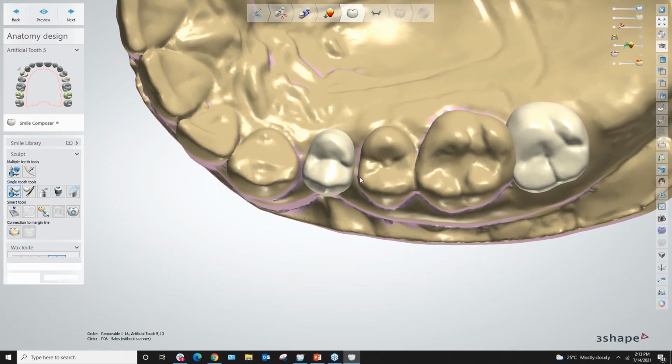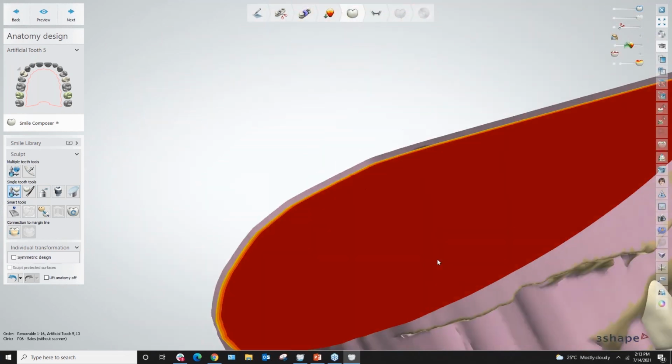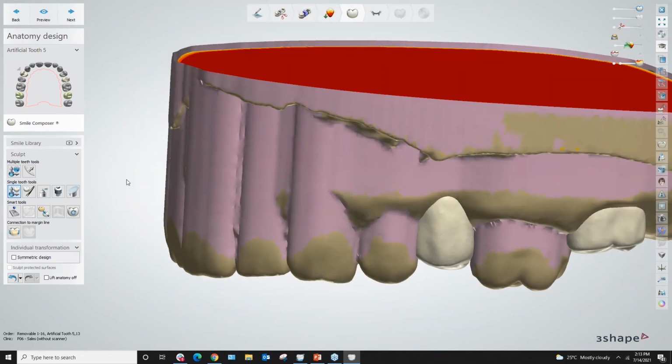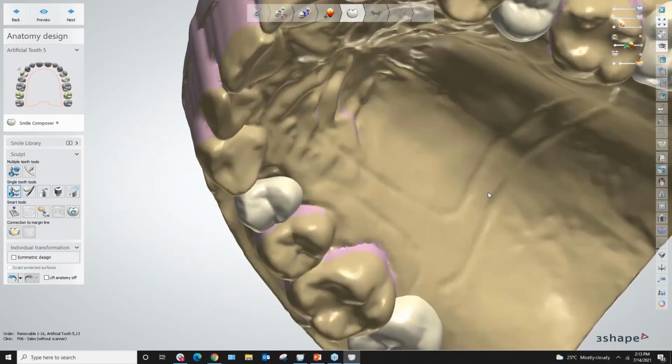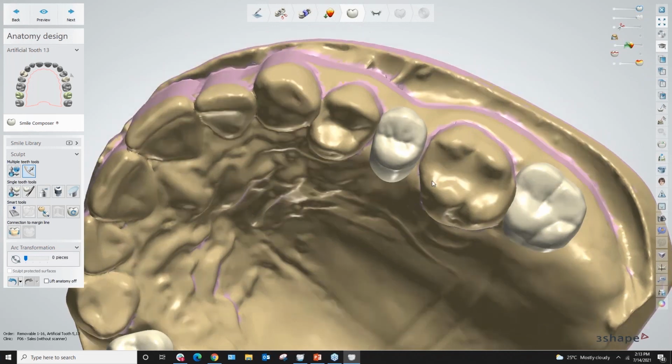Now let's jump ahead and do the same thing for the other side using the same tools with patients. So I will just position it in a way where I can actually have access to it. So first up, I will work on my size. So the size would be a bit more reduced this way.